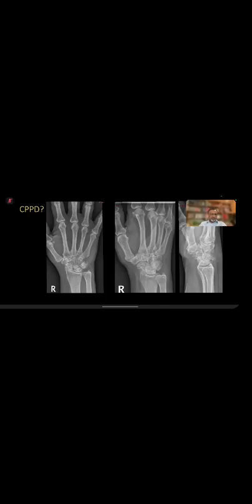But where is the thickest cartilage in the body? Knee, absolutely. Hip probably not, knee is probably the best, okay? So we looked at the previous imaging, and this is the previous imaging. Can you see any calcification? Yeah, calcification there.